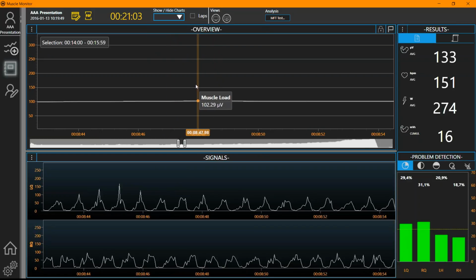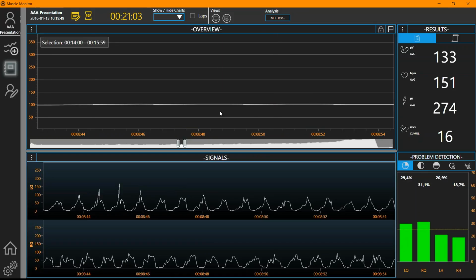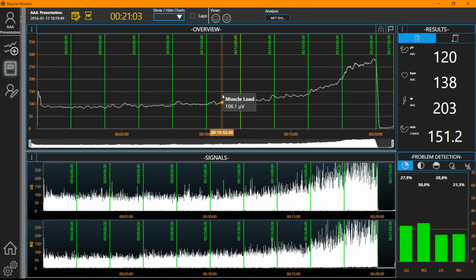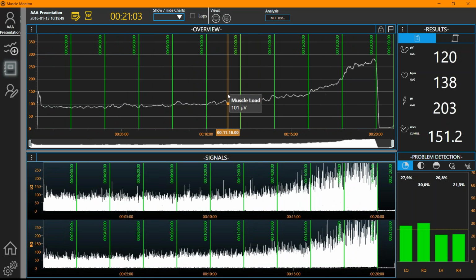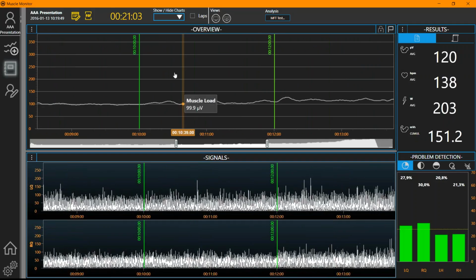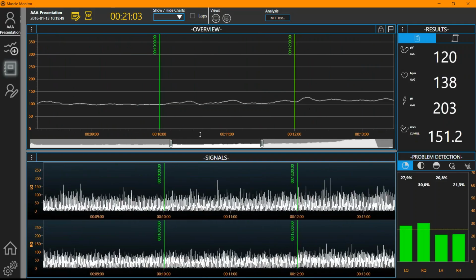Also, new features. Well, the old ones are that you can scale the charts, of course. You can double click to unzoom. You can scroll to zoom. Now you can actually keep the right button pressed and pan it sideways, like this.